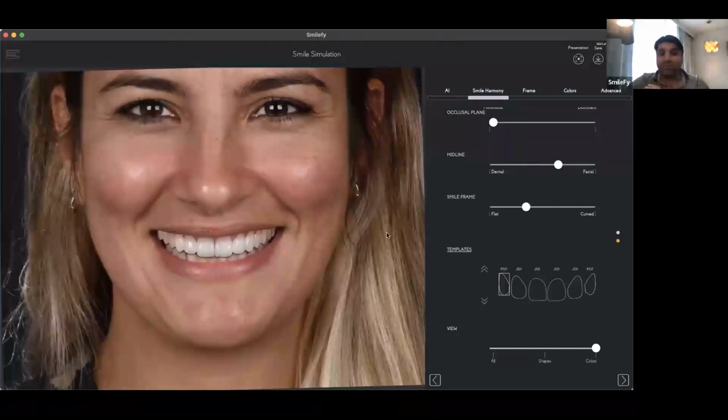2D design has no connection to a 3D smile design. It is just information for us. The patient likes round shapes, for example. The patient likes a dominant smile and some details in the smile. We use this information to plan the 3D smile.